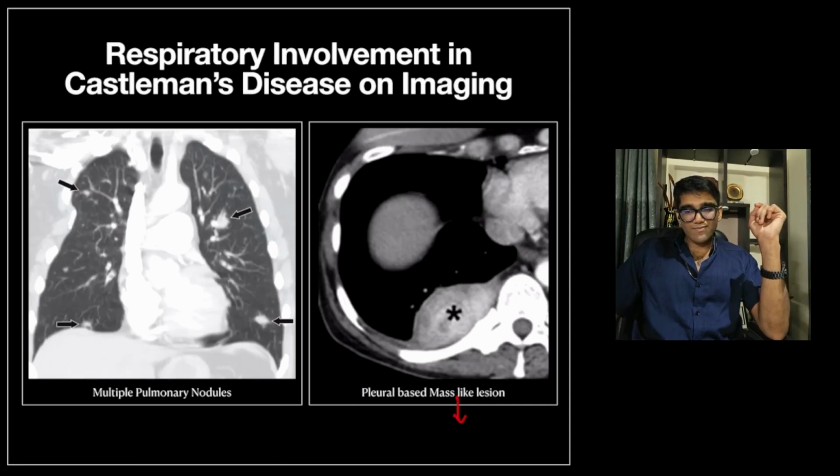That is because there is a lot of impetus put on paravertebral involvement in IgG4 related disease, and although Castleman's can closely mimic that, it is not given enough credit for presenting like this. So I wanted to counter that. That is why I put it here. But yes, it does occur with IgG4 related disease, but it occurs with both IgG4 and Castleman's disease.